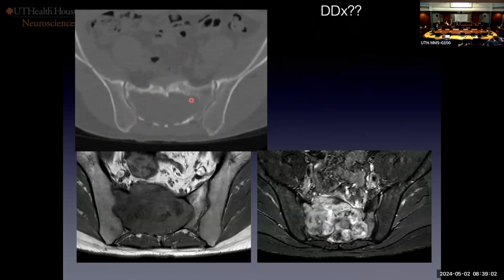It's a very lytic lesion, but you could argue that there's some sharp margination here, even sclerosis, but yet there's definitely aggressive features with cortical breakthrough posteriorly. On the T2 weighted image, the lesion is fairly low in signal, right? Which is a little unusual for metastatic disease or plasmacytoma. A lot of vigorous enhancement. So at this point, just think, what is your differential diagnosis? If it was a 60-some-odd-year-old, you'd think Mets, plasmacytoma, except for that low signal on the T2 weighted image should be somewhat disturbing to you.